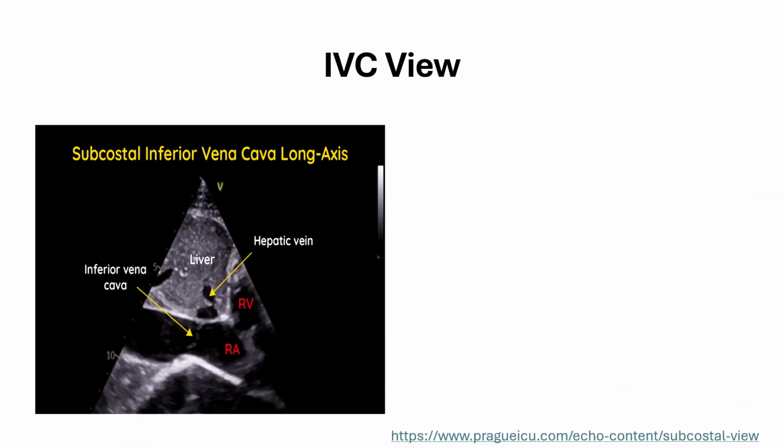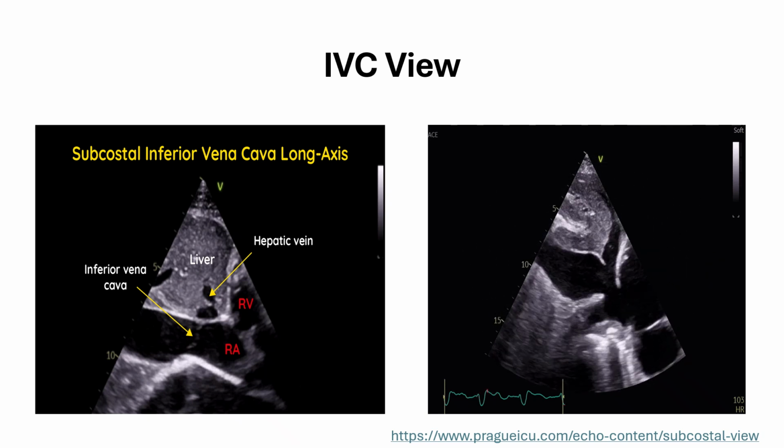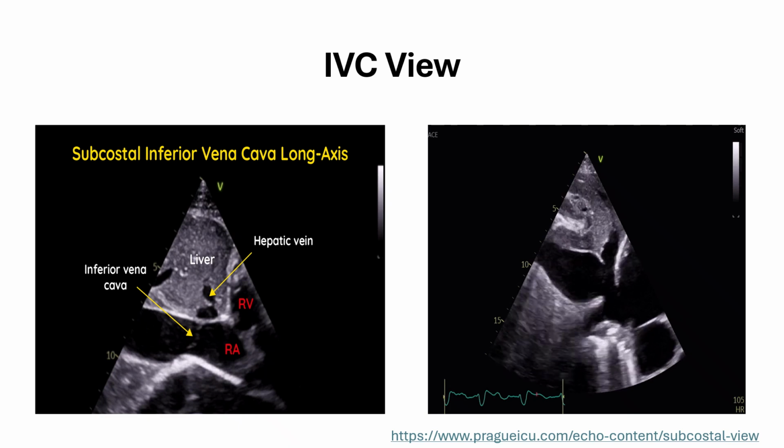Let's take a look at the IVC view one more time. Here on the left, you see a frozen image showing you the anatomy of this particular view. And on the right, you see a video clip demonstrating the same. Please pause the video if needed to review this slide.